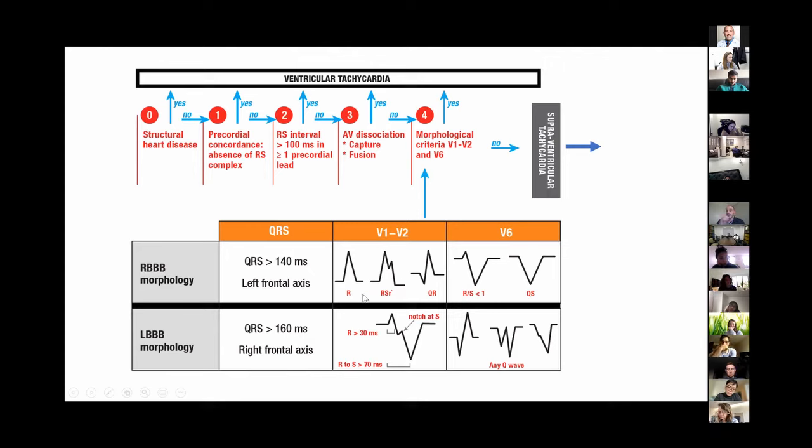The abnormal ones that are more frequently encountered in VT have this first deflection higher than the second one. You might say, oh, the left rabbit ear is taller than the right one, but really it's just a reflection of abnormality of depolarization, because this is not right bundle. It's something weird that is depolarizing from the ventricle.